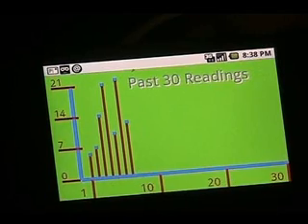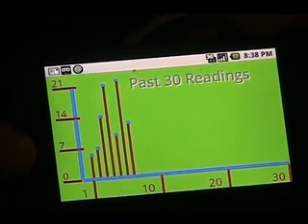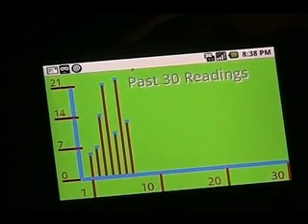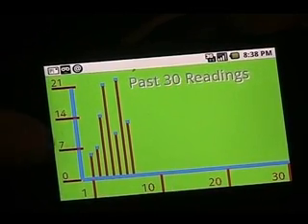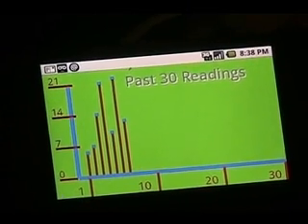What I do when I'm verifying the graph is I make an entry for 7, 14, and 21. And then I did an entry of like 7.8 to make sure the tenths were showing up properly.